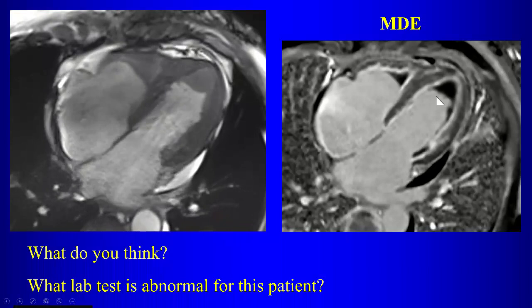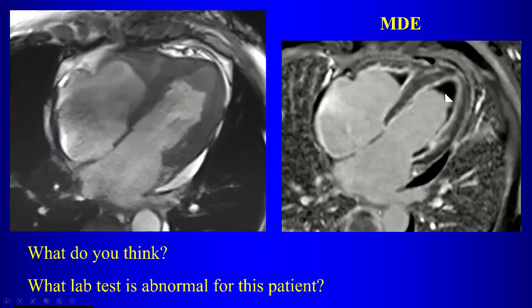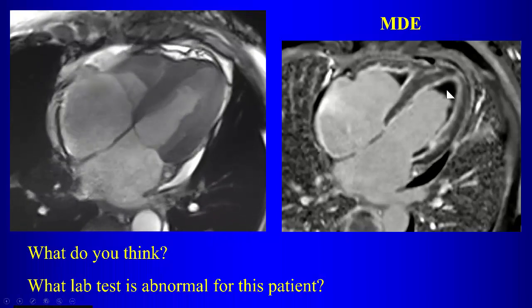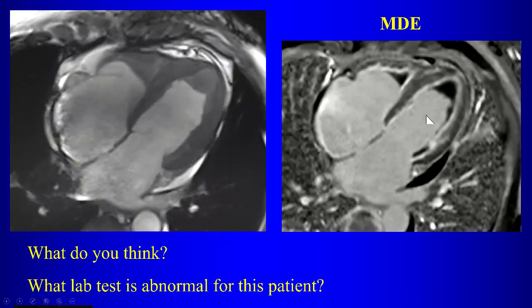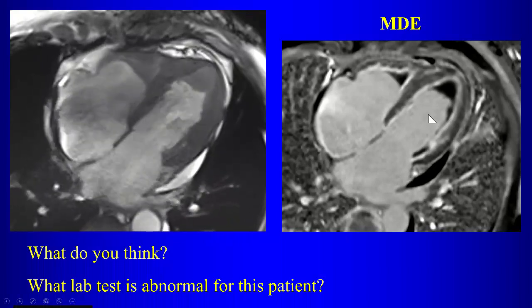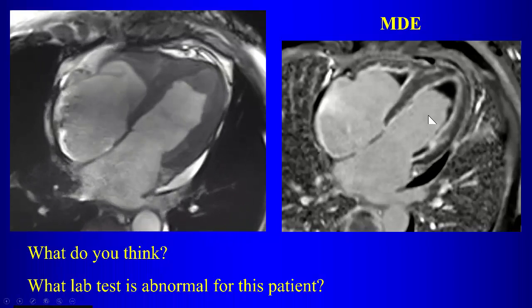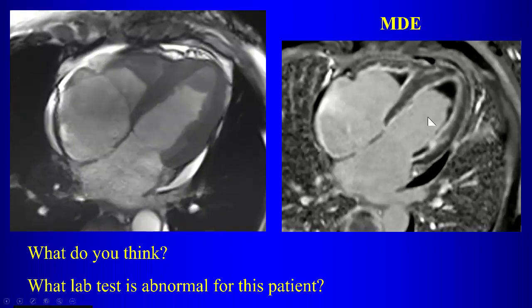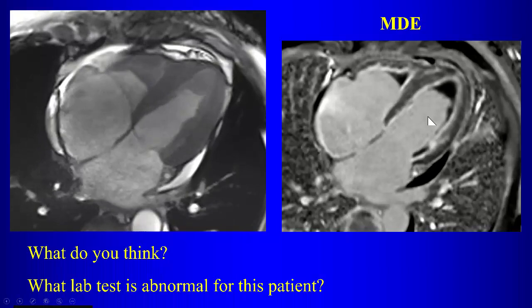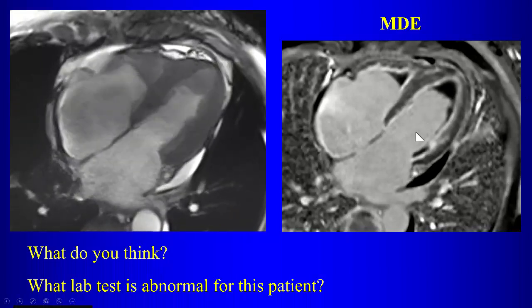Infarct? Is that in the myocardium? It's not. So what is that? Thrombus. So are you surprised that somebody has delayed enhancement in the apex of the ventricle with a thrombus in there? No, you're not surprised by that, because what's the most common cause of subendocardial delayed enhancement? Infarct, right? So could this patient have an infarct with a thrombus at the apex of the ventricle? Why not?